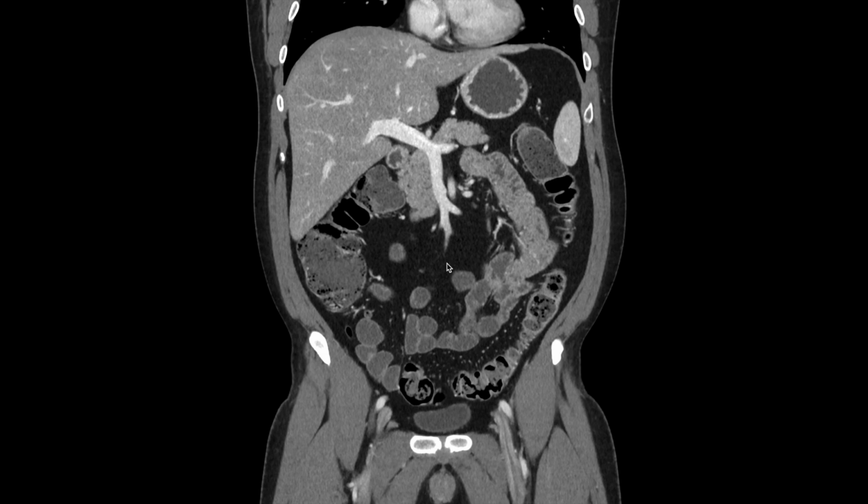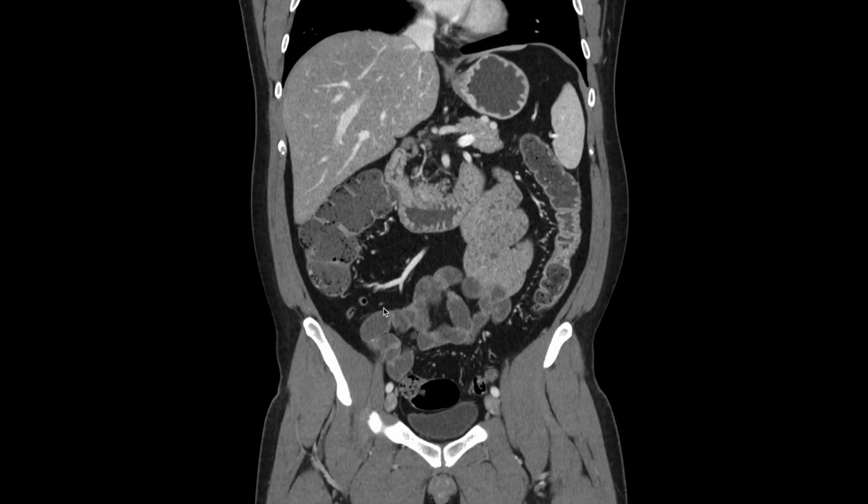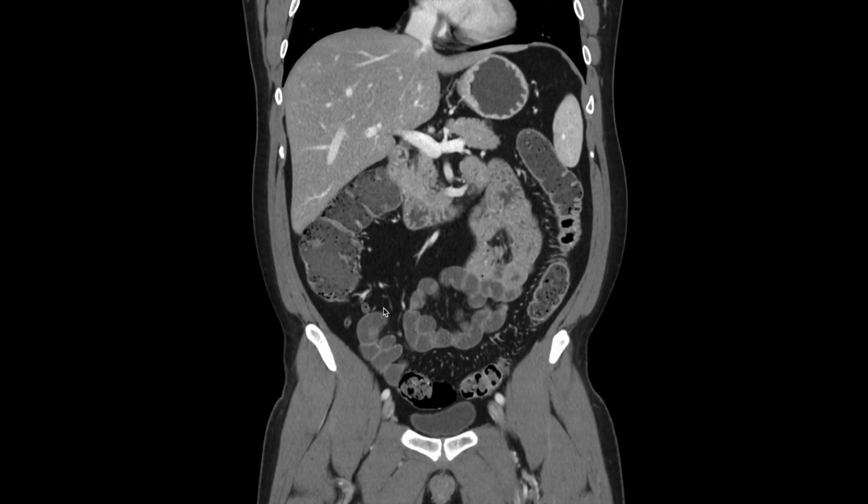This video will review how I read a CT of the abdomen and pelvis in the coronal plane. Radiologists primarily interpret CTs in the axial plane, but the coronal plane is also a great and valuable resource. It provides a more intuitive look at the patient as if you were looking at them. It is often more intuitive to referring providers and surgeons.